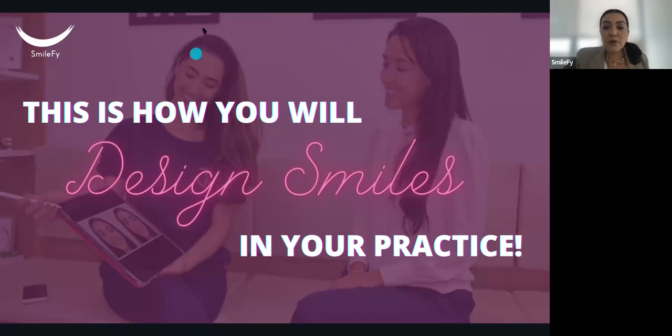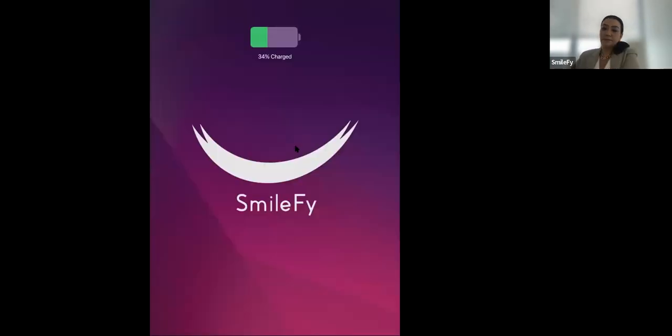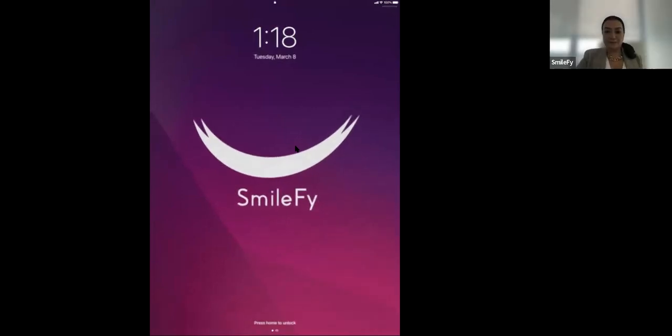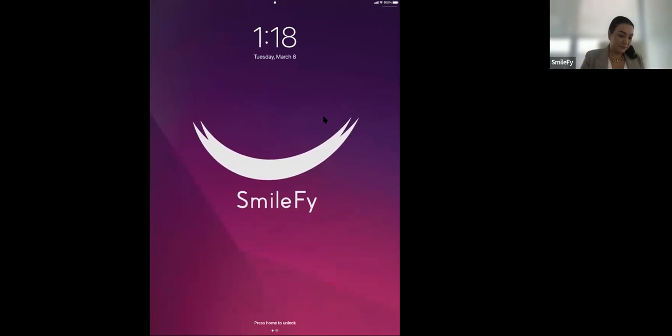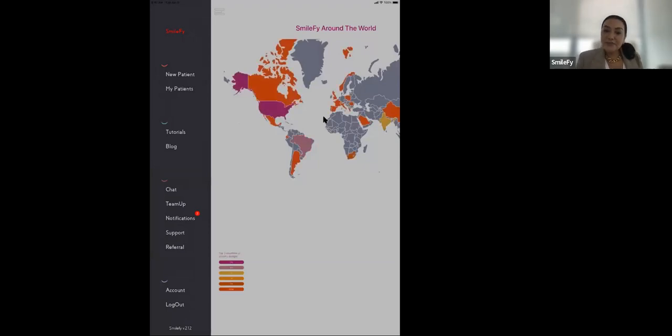So let's get started. I want you to open the app. I'm going to share my screen with you. So let me share my iPad. And let's get started. Okay, so this is our app, Smilefy. When you open it, you have the menu. Today, as I told you, we can work the same patient together, okay?